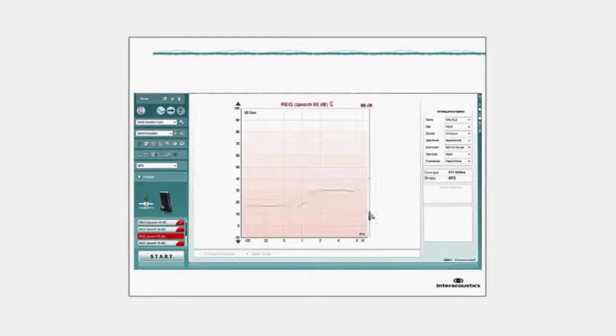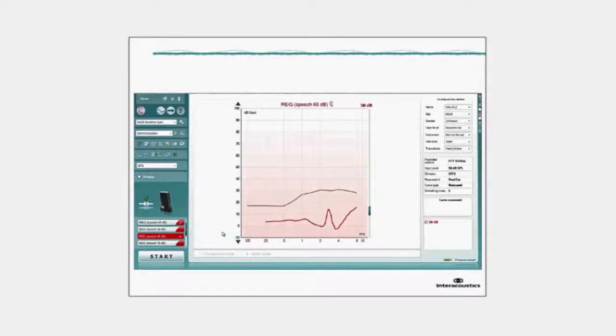So what you can see here is that on loading the protocol and increasing and decreasing the intensity, the target that you have on the start of the screen is moving, meaning that the default intensity set for the measurement is not fixed to the screen, so that we only have one target curve. After running the measurement, the target and the measurement will lock together so that they are associated. This means that they are then paired, and then on manipulation, they will not change. So notice that the measurement and the target remain on the screen because they are in use. They're paired together.